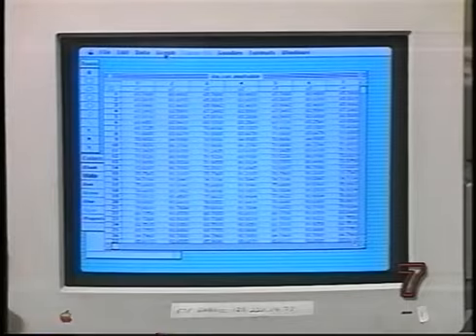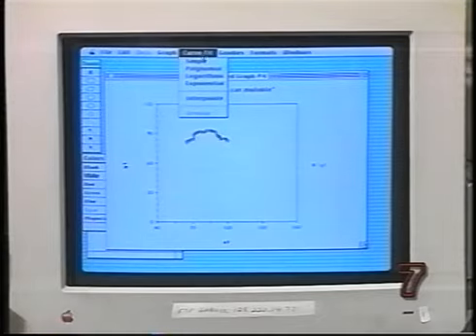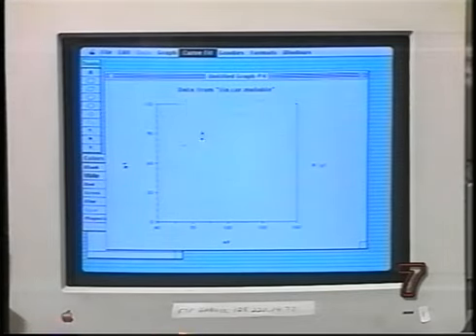The next thing we want to do is graph the data. This is now an image of the upper surface of the tongue in cross-section during the vowel E. The sides of the tongue deform around the sides of the palate, and of course the tongue is quite elevated in midline. Fitting it with a curve, we'll fit it with a quadratic or second-order fit.